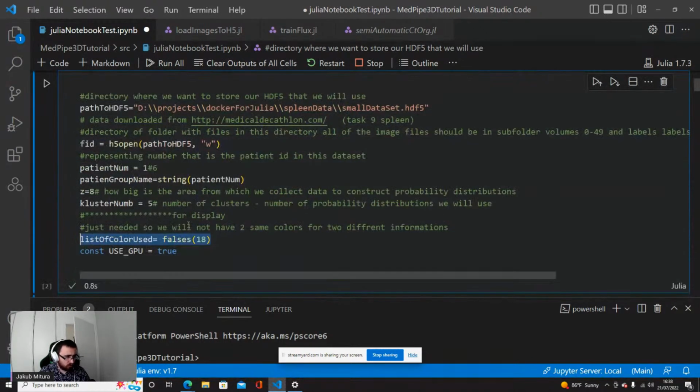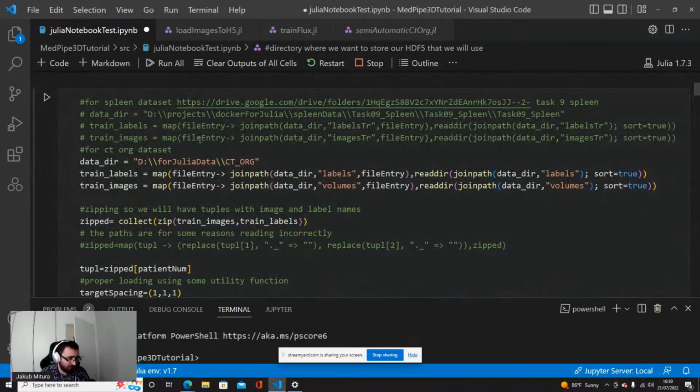What is also important, as I mentioned at the very beginning, but I will tell it one more time: I'm not showing the state of the art. The purpose behind the code that I implemented in this workshop is not to get the highest performance. It's to show exactly how it works. So I'm using very simple things and showing how to use my tools to some extent and other tools and how they play together.